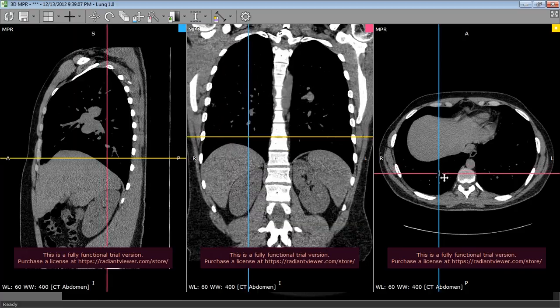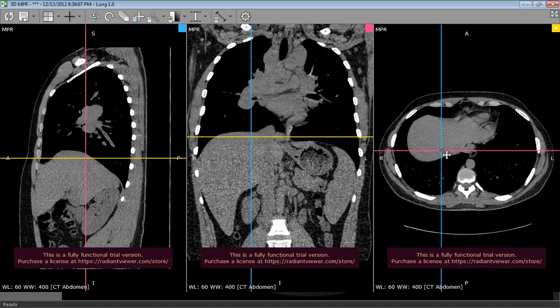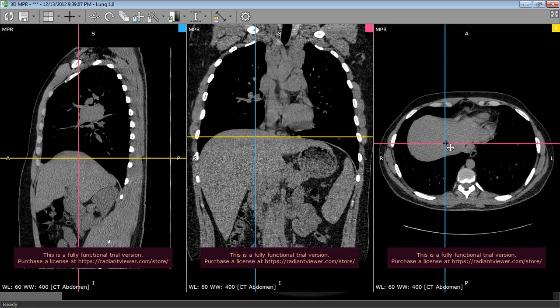Actually, in such a case, we have nothing to differentiate. We have generalized lymphadenopathy, not only hilar. We have hepatosplenomegaly. We don't have calcification. So till now we have equal possibilities for lymphoma and sarcoidosis. So they have to be put in the differential diagnosis list, and the pathology will differentiate between them.